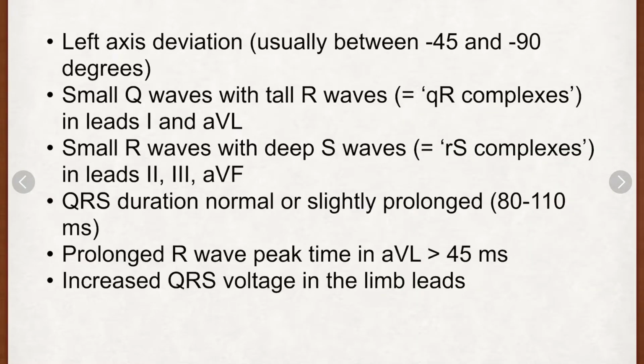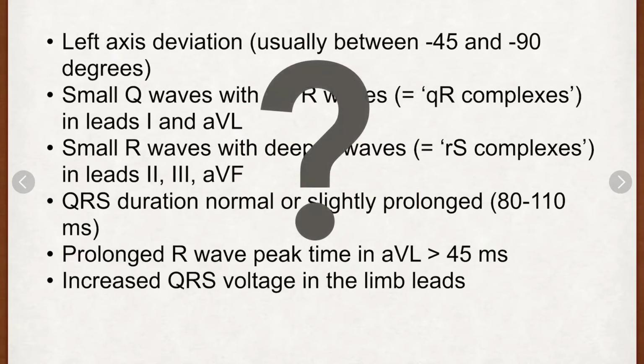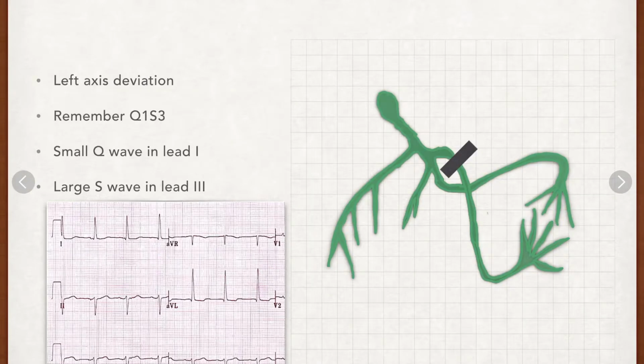Here's how you tell. I'll let you take a moment to read through all that, because that's really too much for me to remember, but I'm sure you've got it. I don't. So looking around, I tried to find something that would be easier to remember. And what became easier to remember for me was this Q1 S3 thing.